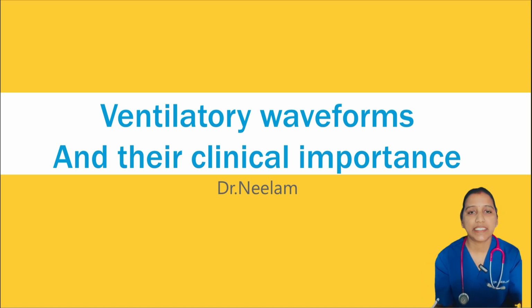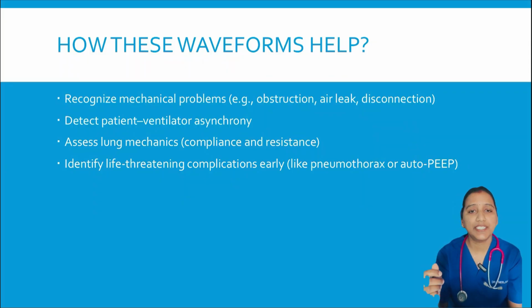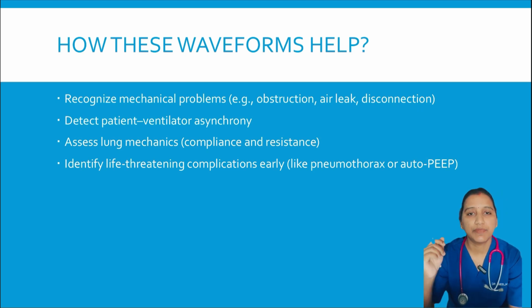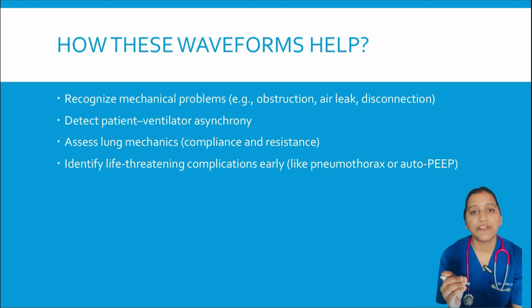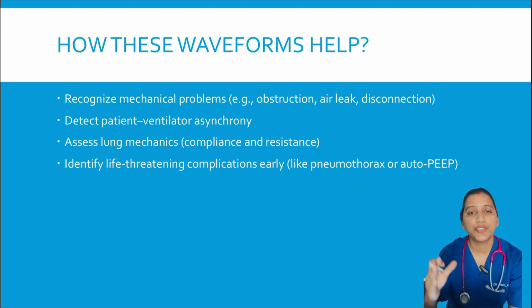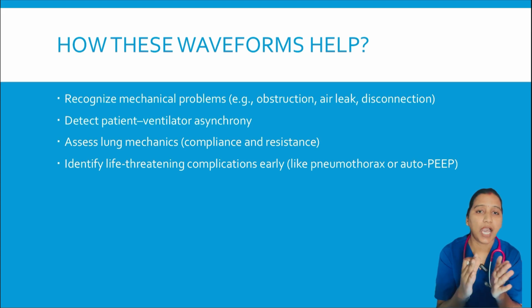Let's get started with the basic ventilator waveforms. Mechanical ventilation is not just about setting numbers on the machine. It's about understanding the interaction between the patient and the ventilator. These waveforms or graphics visually represent this interaction. They show how pressure, volume, and flow change with time during a respiratory cycle. So let's see how this helps.